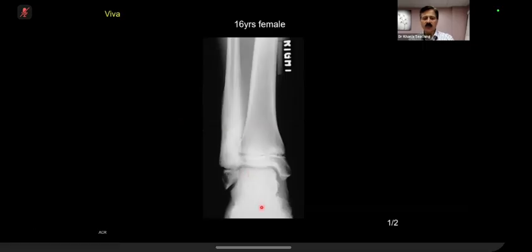What happens in the narrow bones, in the fibula as well as ulna, is that the classical teaching of eccentric versus central does not hold true, and these kinds of cases will confuse you always. I'll show you more, where in a narrow bone like the fibula or ulna, the principles do not hold, for the simple reason that there is not enough place within the medullary cavity, so it will appear more central.